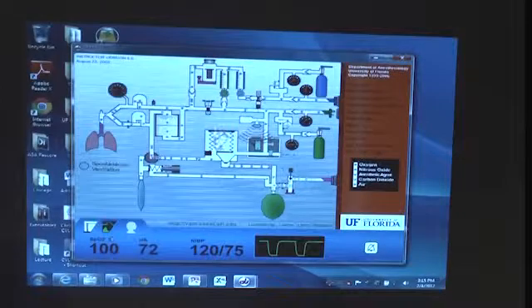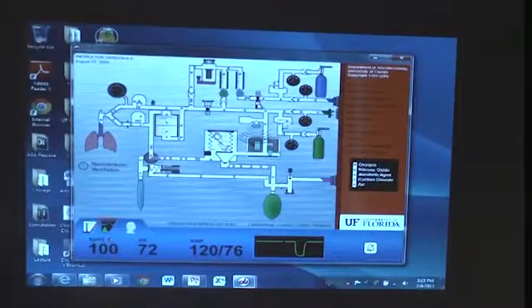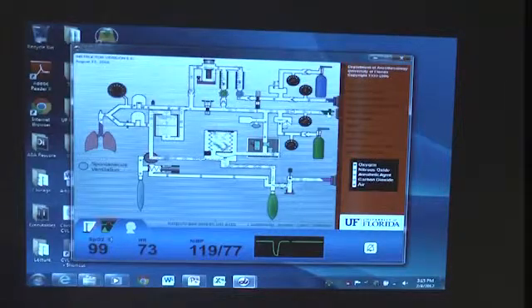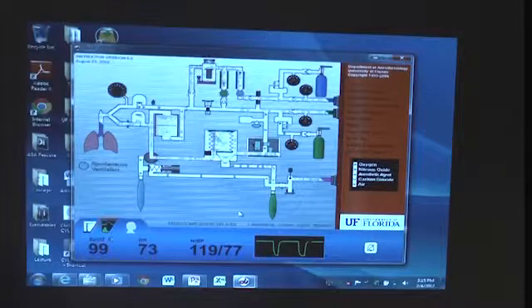Do you see that? There's a spring here. If the pressure on the bottom from the oxygen is enough, it will push against the spring and make this hole line up with the nitrous, so nitrous can flow. But if I don't have enough pressure, then the spring will be strong enough to close off the flow of nitrous. Again, and again.